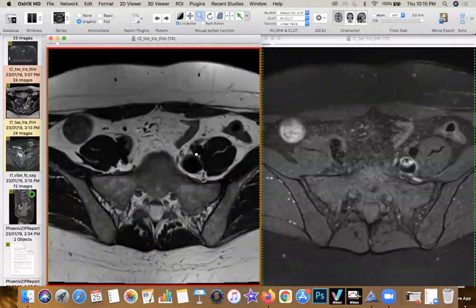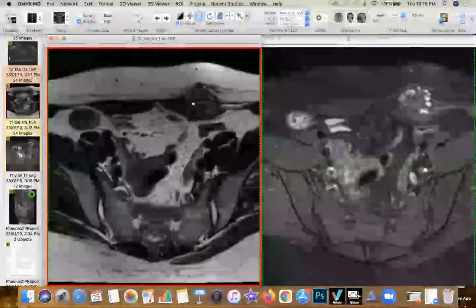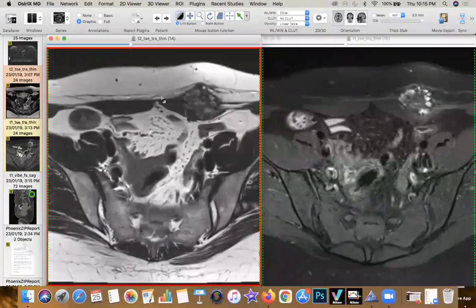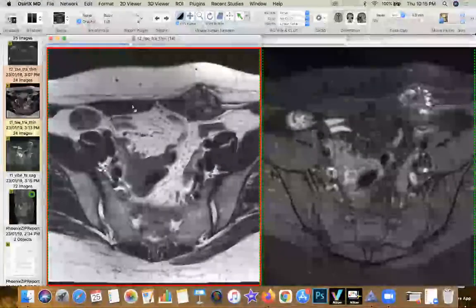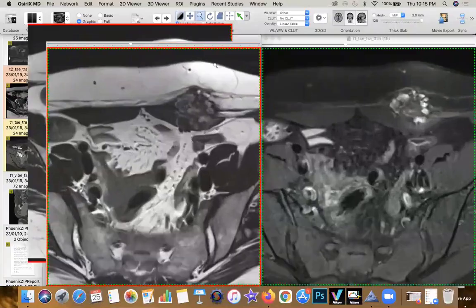And you can just do a non-contrast MR and look at all the possible sites where you could have implantation of endometriotic tissue. So you can see that this is the level of the Pfannenstiel incision. It's typically in the infraumbilical parietes. It's a horizontal scar which arcs on either side of the midline or a little more laterally, anterolaterally. And now you can see why the patient was having focal pain at this point.